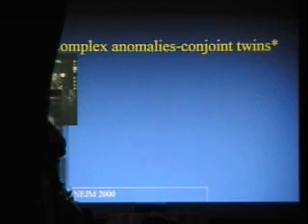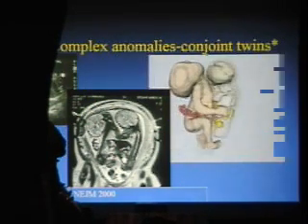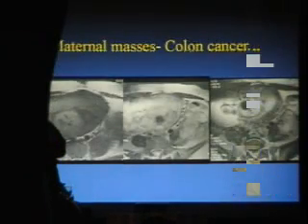And just some more images, some complex cases like this one. It's useful in fused livers here in conjoined twins, and you could see that they were fused. One was an acardiac twin, and the other one had a normal four-chamber heart. The big question was, are there two biliary systems or is there one? There were two, and the surgeons were able to divide the livers nicely. We were able to do, again, the segmentations and show you the happy outcome of the baby surviving.